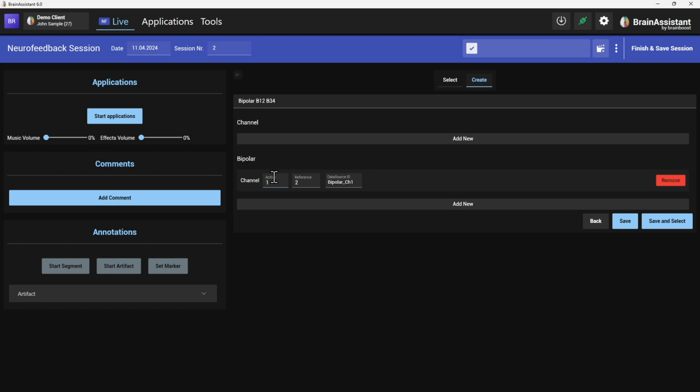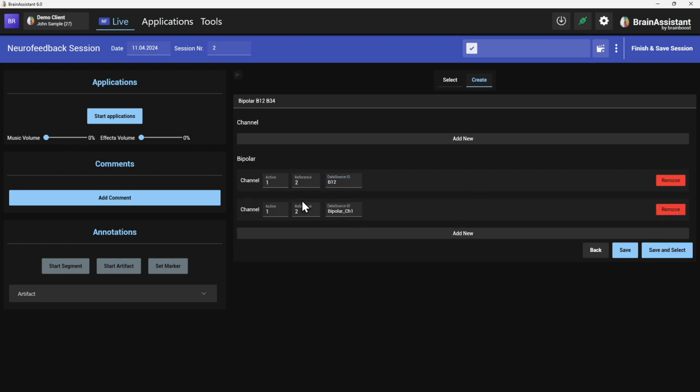Now here this says, hello, channel 1, active channel 1 refers to, and not the reference on, for example, that adapter that I just showed you, but it refers to channel 2. How should I name it? So in the beginning, you need to write that down. At some point you remember. So I will call it bipolar, B for bipolar, 1, 2. So channel 1 is the active and channel 2 is the reference. Add.